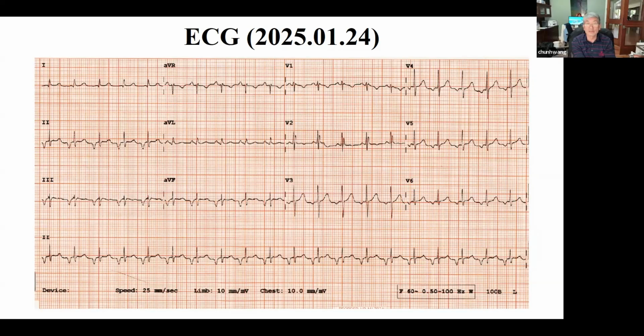Well, it is most likely the left side, the posterolateral or posteroseptal area, because of your precordial P wave transition. V2, V3, and then if you look, the negativity grows gradually up to V4, which is the deepest negativity, and V5 and V6 become a little bit less negative.